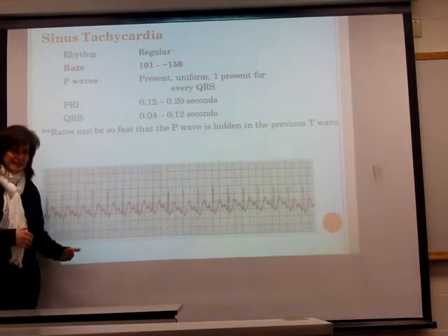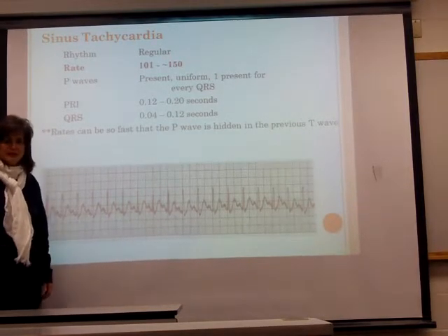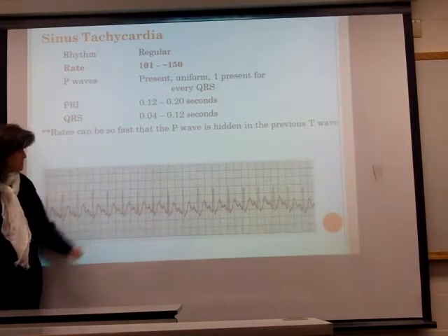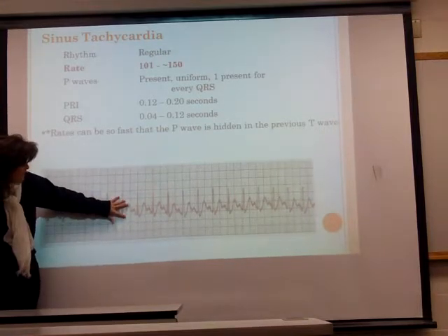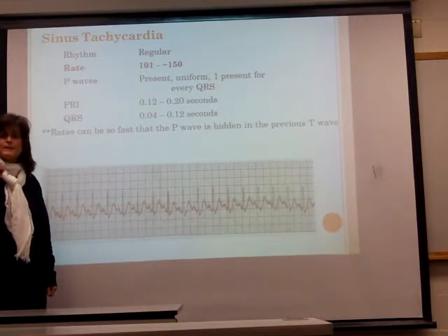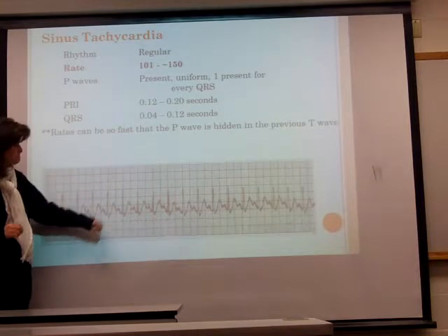Now, it really is, and I can tell that by the bowing action here, but that's more of an advanced type of treatment, or advanced type of interpretation. I don't want to get you confused at this point. The next thing I'm going to look at is my T wave. My T wave is absolutely peaked. It's about 1.5 big boxes. And remember, a peaked T wave generally denotes hyperkalemia, okay?